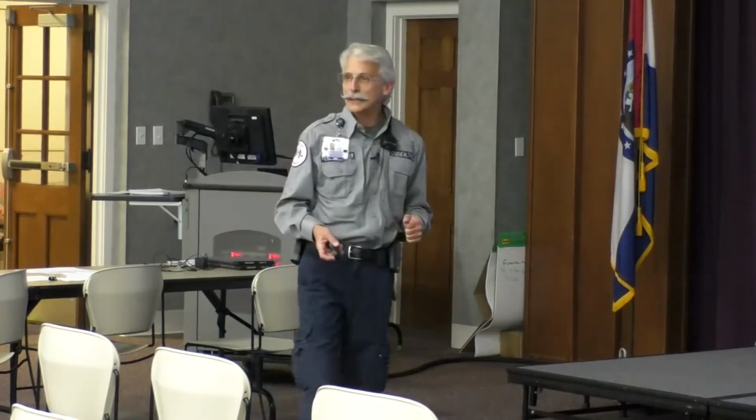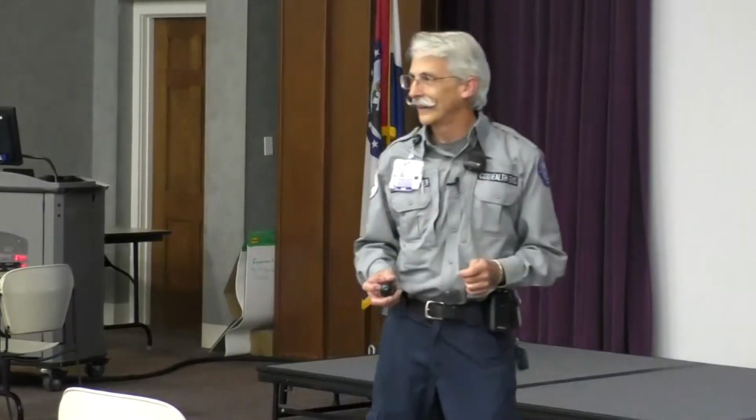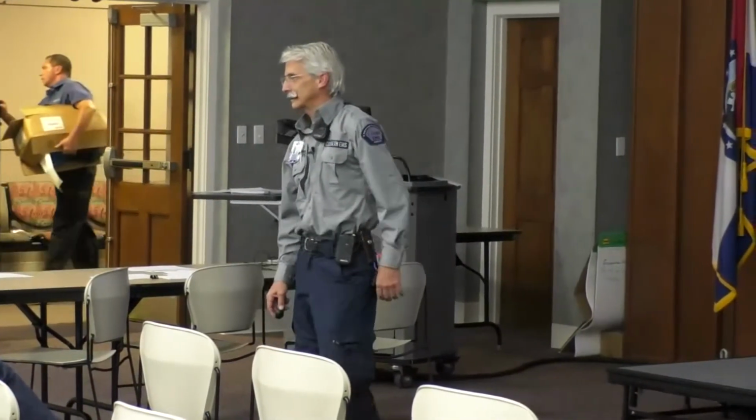When you call to the hospitals, do you call and tell them they're having an inferior lateral? They don't like that, do they? No, then they start with what leads are doing what. So just start with what leads have the elevation in them. 2, 3, AVF are elevated. Yeah, 2, 3, AVF and V5 and V6 are elevated in this one. Absolutely, with reciprocal changes. And if they really want to know the reciprocal changes, I guess they can ask, and I'll tell them.